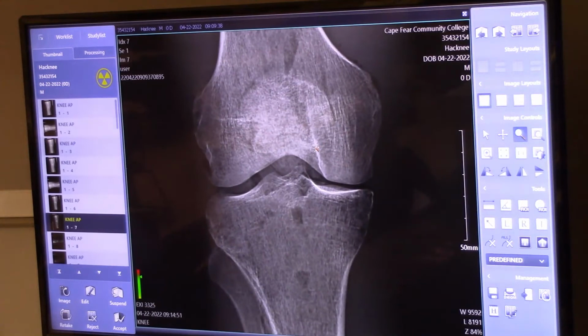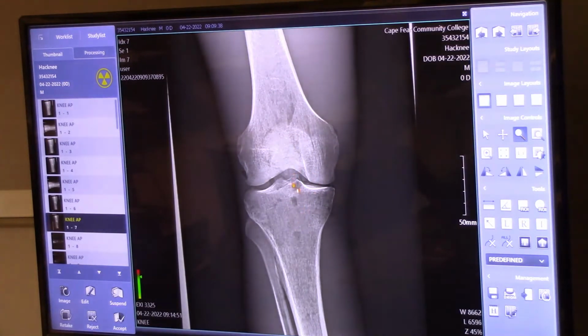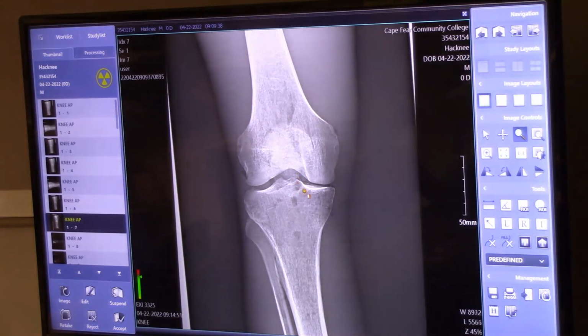Can we see everything we need? It looks weird, doesn't it? It looks dark. Can we lighten it up? Why, yes, we can. Okay, we can make that a nice looking x-ray. So if we can do it, so can the radiologist. So that's definitely passable, even though it's hot.